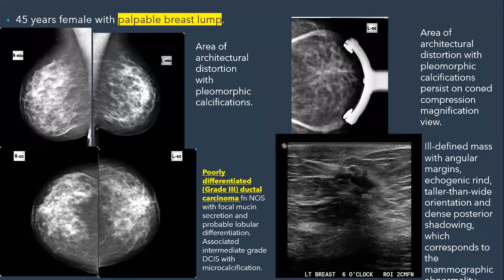And even biopsy can be taken: if they can clinically palpate it, they can take a biopsy from that palpable area, a blind biopsy. We said before, combined negative ultrasound and mammography does not completely exclude breast cancer. I remember it is up to 96%.